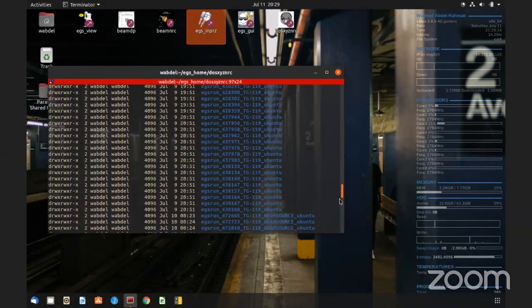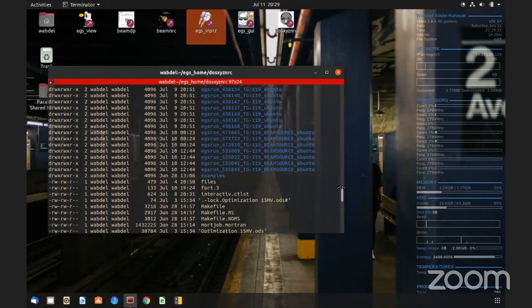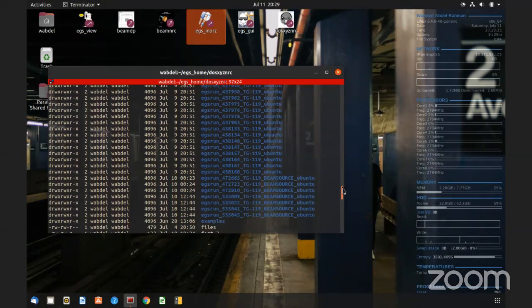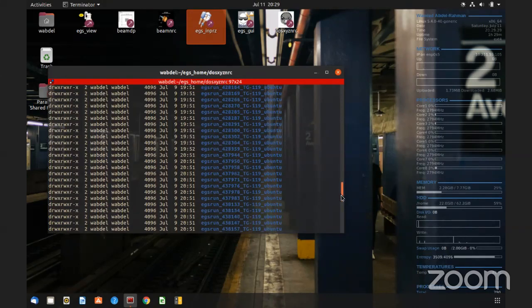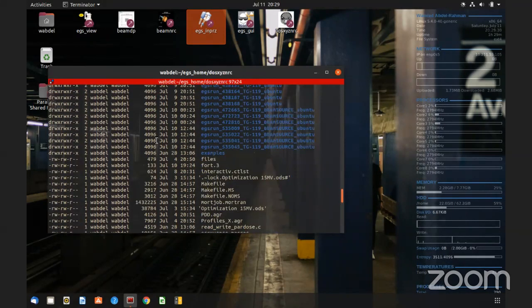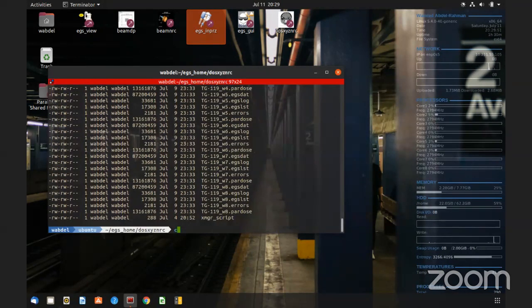what you need to do is go to these folders. It's sometimes confusing, because sometimes I restart, and obviously I don't do like 40 submissions here. But you can figure out, for example, the date when this was launched, and then you go inside and copy back the files into the main folder, and then you can restart the simulation. It needs a bit of playing around, but that's how you do it.